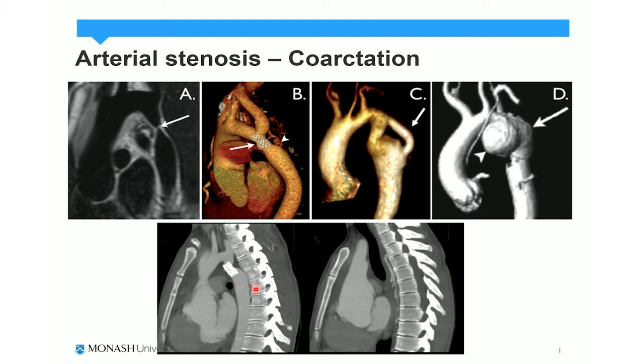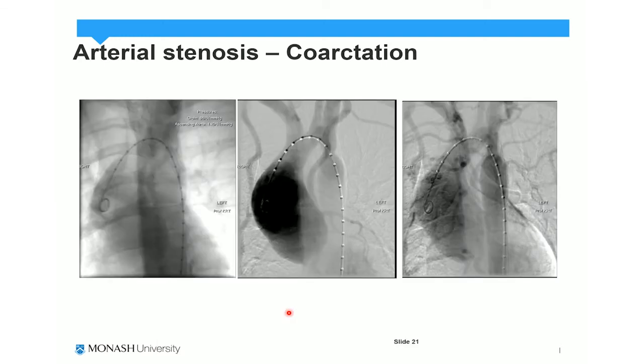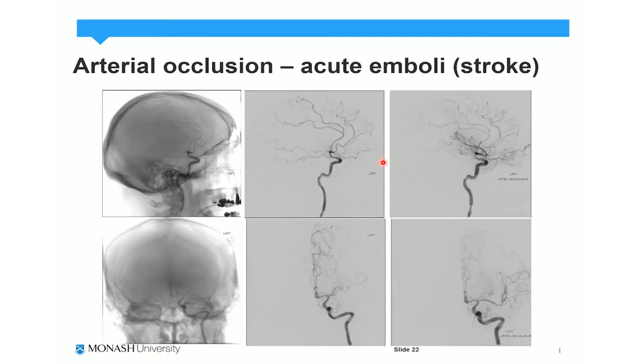This is the imaging of the aortic arch in a sagittal plane on CT with a stent in this case. The same angiographic imaging of the same patient demonstrates a very dilated ascending aorta with a highly narrowed coarctation and dilated descending aorta. There is also the presence of enlarged internal thoracic vessels, which are providing collateral circulation around the narrowing.